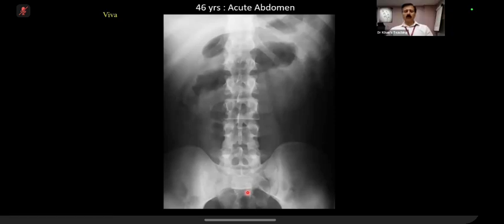Okay, good. Now, you have inferred that there is colitis, and you have said correctly that the mucosa is inflamed. This is your inference. But on which grounds? I want to hear those descriptive terms. You have concluded correctly, but how have you concluded that?